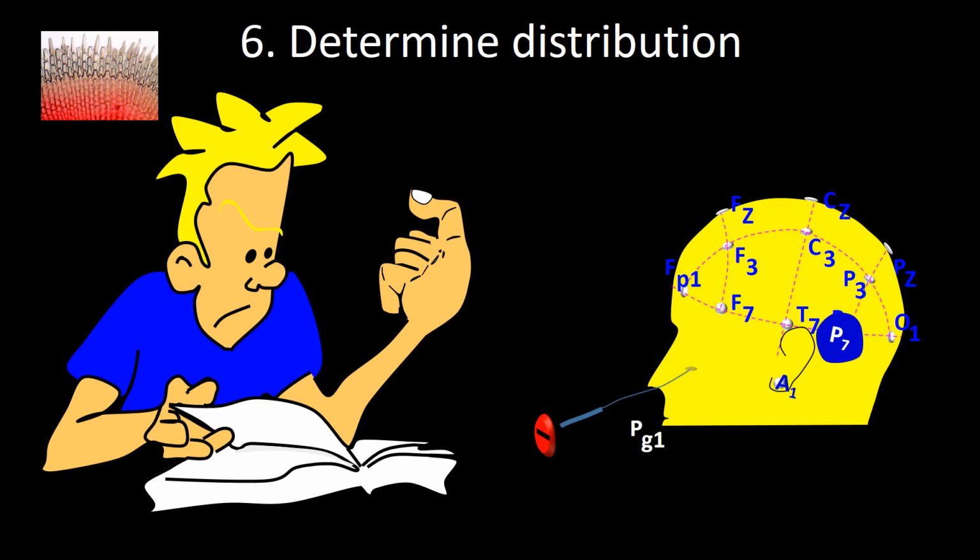Scalp electrodes, on the other hand, show a positivity, usually in the posterior temporal region, that may have a significant anterior spread to involve the anterior temporal region as well as the frontal region.